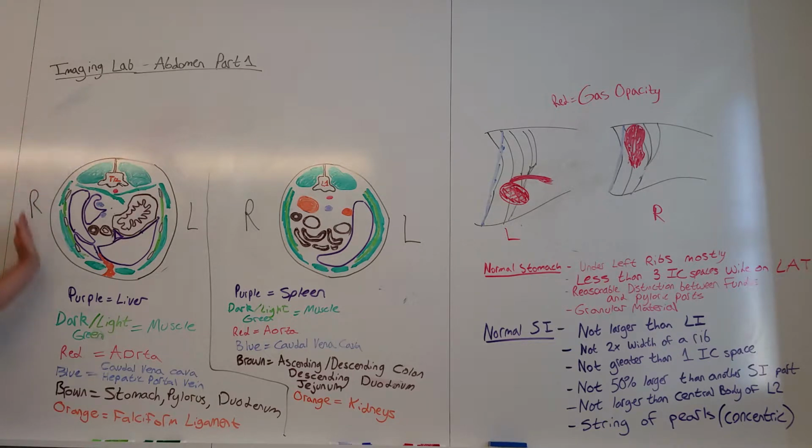On the more lateral side of the walls, since we're still in the land of the thorax, we're still going to see some latissimus dorsi, and so that's this muscle up here. As we move a little more ventrally, we're going to have our external abdominal oblique, and the muscles that run in between our ribs are our intercostal muscles, so external and internal intercostals. At the very midline of our body, we're going to see our rectus abdominis.